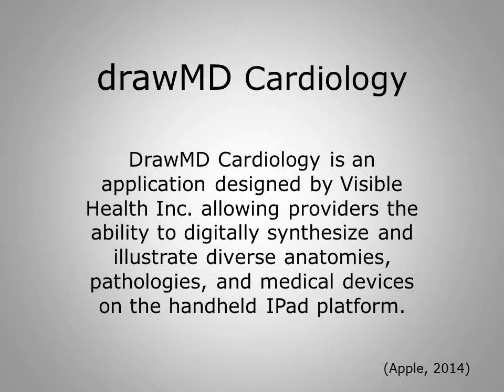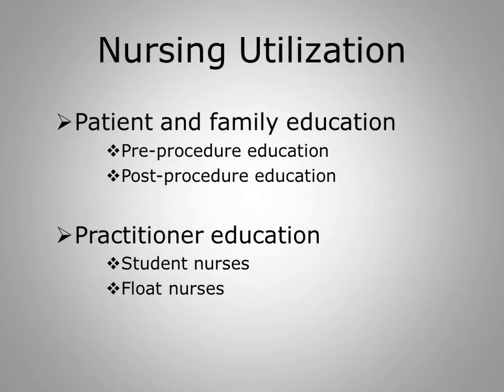drawMD Cardiology is an application designed by Visible Health Incorporated, allowing providers the ability to digitally synthesize and illustrate diverse anatomies, pathologies, and medical devices on the handheld iPad platform. This application allows practitioners the ability to provide visual reference for educational purposes.